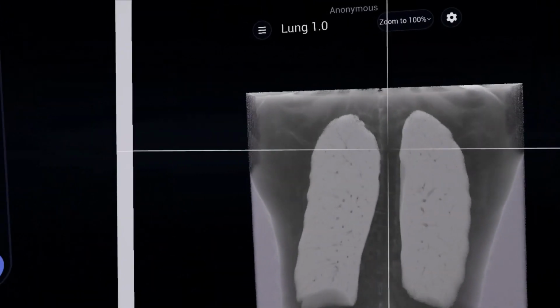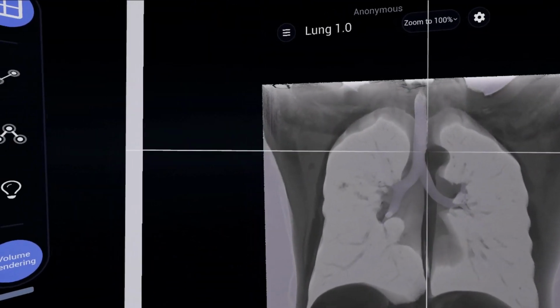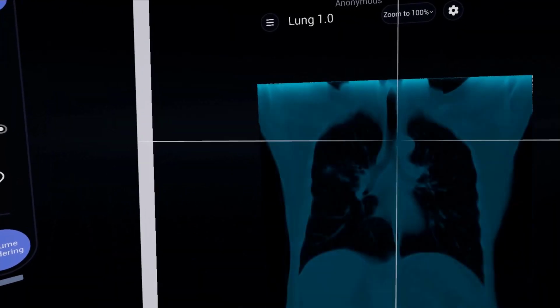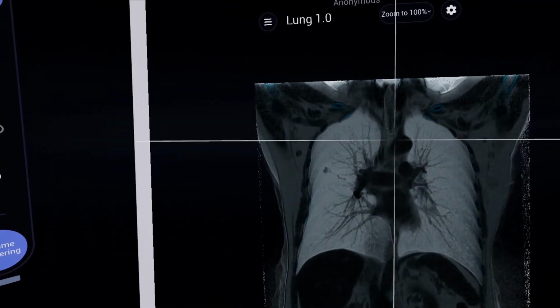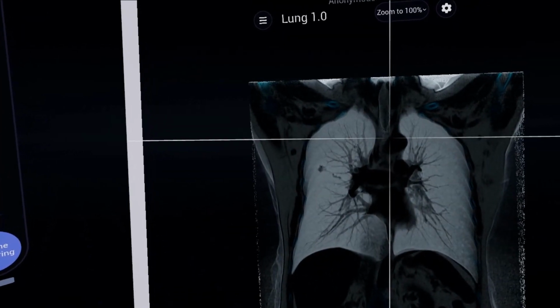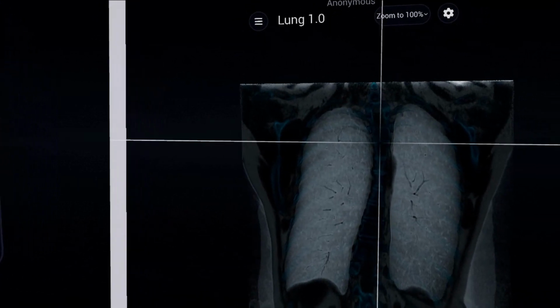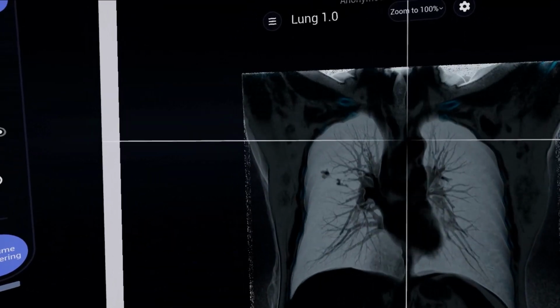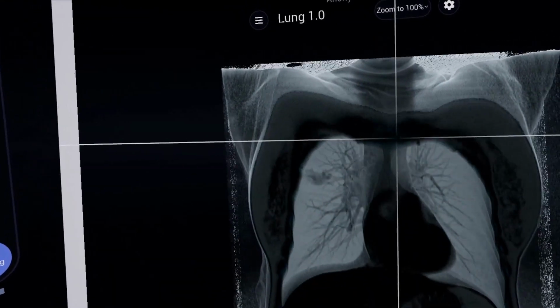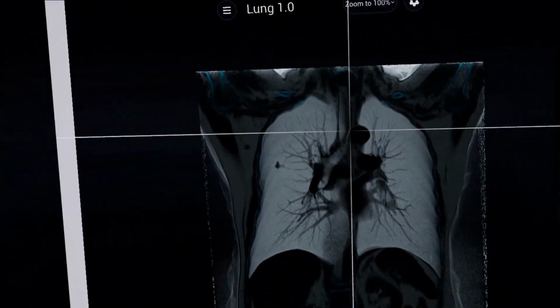A combination of various presets, visualization windows and multiplanar reconstruction provides a clear and understandable display of the tumor in the body volume. This approach allows not only to help the surgeon to plan any upcoming interventions, but also to clearly show the pathological process to the patient. Moreover, the ability to jointly view the study in Bodyscope ensures confidentiality and complies with the principles of today's personalized medicine.